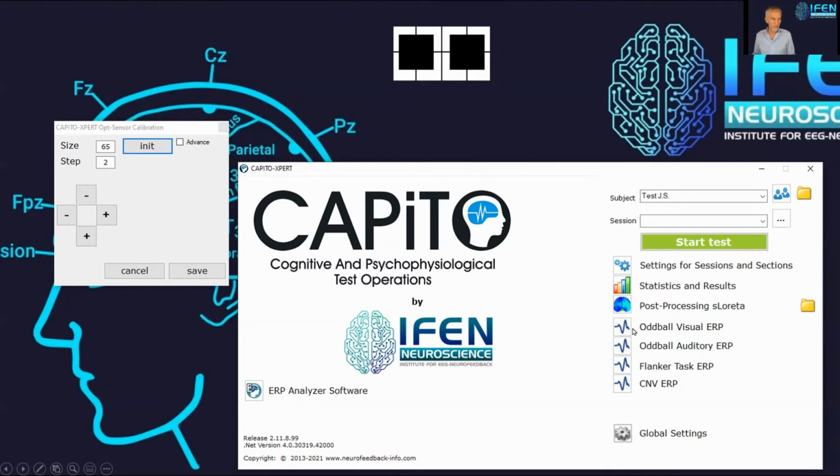Here we have some buttons where the user can just use predefined stimulus presentation protocols, but there are also many options to create optimized individual stimulation protocols, which we will see in the next slide. So one of the very simple things you can do with this tool is just to create a simple visual oddball paradigm.